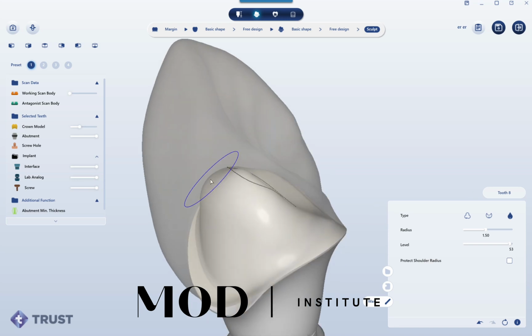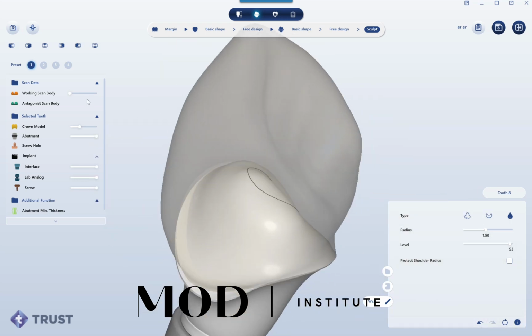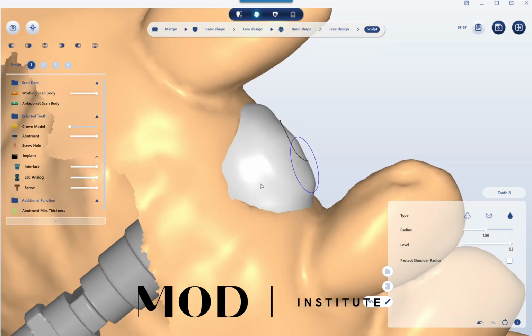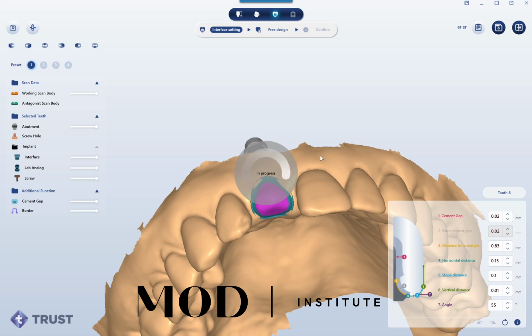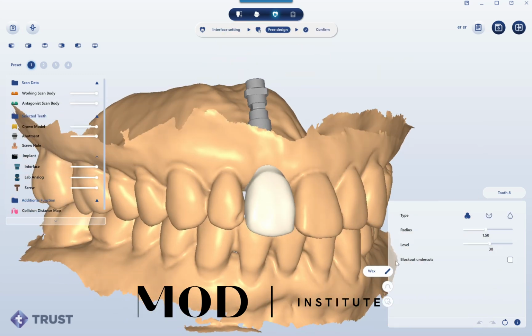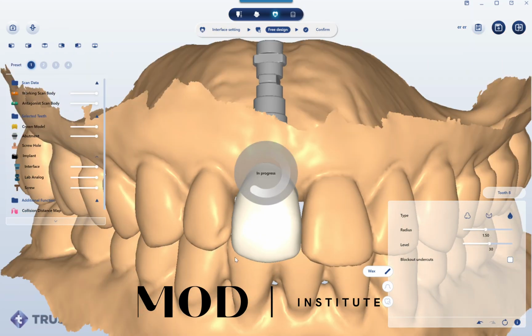So here we have a full contour crown design with an abutment. Now, if you wanted to create like a little custom healer, all you do is just melt your custom abutment into like a little button. And here you could kind of freeform it. Like, let's say you were worried about you not getting torque and you're going to put like a bridge there, or a Maryland bridge or something. You could have a little custom healer down there with a crown on top.